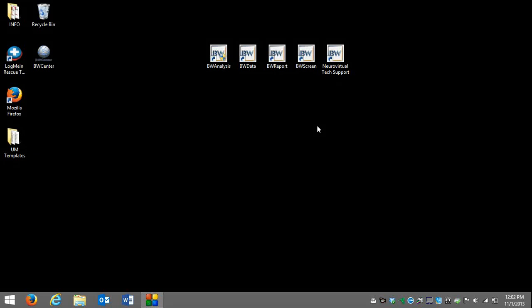Hello, in this presentation I will discuss the BW2 and BW3 EEG software. On the desktop we have a total of 5 icons all labeled BW. The first one is labeled BW Analysis. This is the recording review software. This is where we could create new exams, generate reports. The full software package is called BW Analysis.